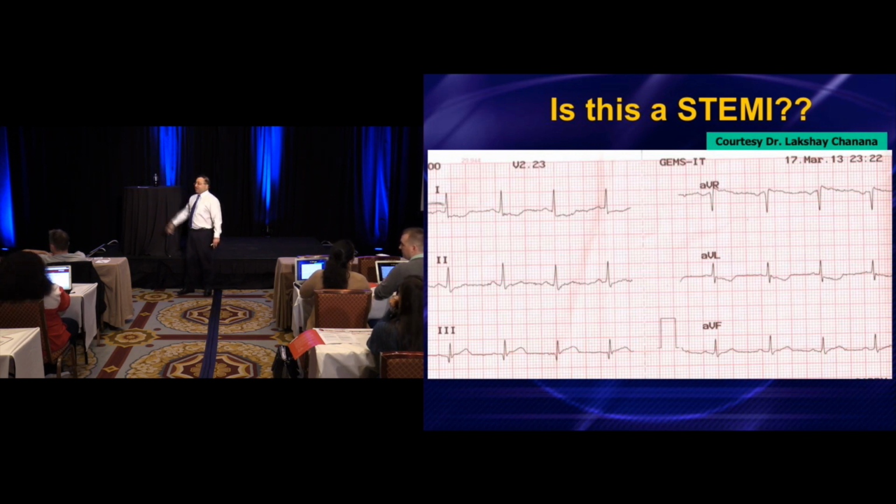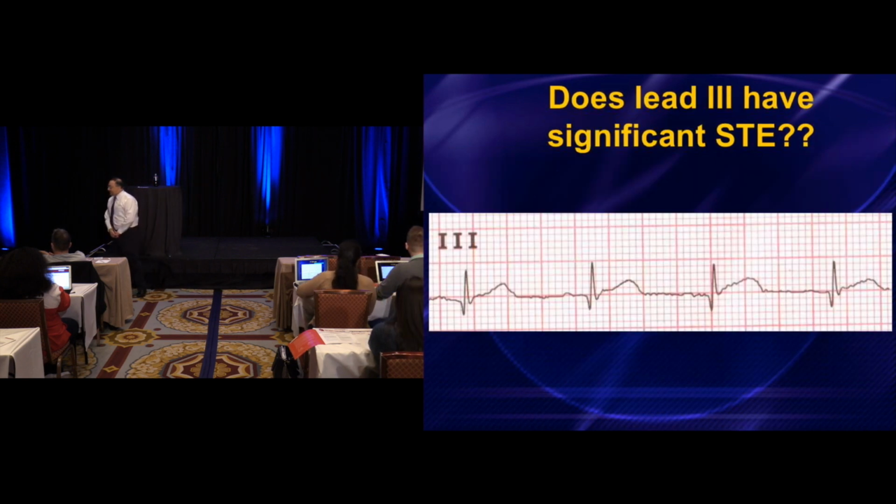How many people say, based on this 12-lead, no streptokinase? All right? How many people refuse to take care of him? So all the rest of the people, I didn't see them raise their hand. All right, fair enough. All right, that's fine.